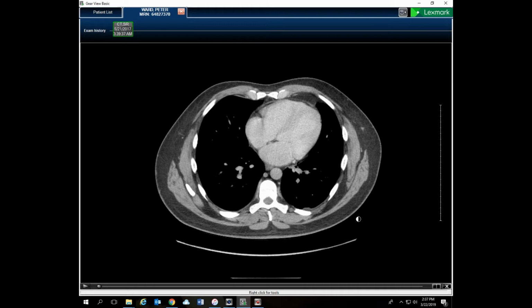So here, it's an abdominal CT, but it's starting fairly high up, so we can see my heart here. For anyone who's unfamiliar with the basic layout of a CT or MRI scan in the axial or horizontal plane, you always look at it as though the person's on their back. No problem there. We've got the spinous process of the vertebra right here, and with their feet coming out towards you. So if you envision this image being someone who's coming with their feet out of the screen, this is the left side, and here's the apex of the heart, matches up, and this is the right side.